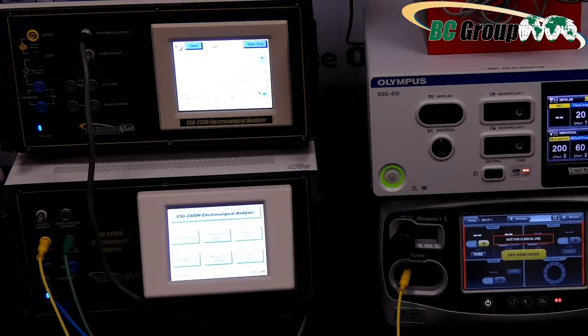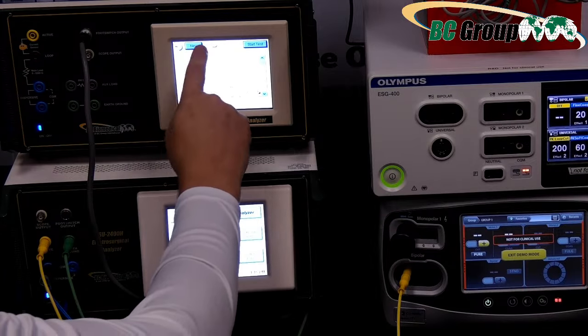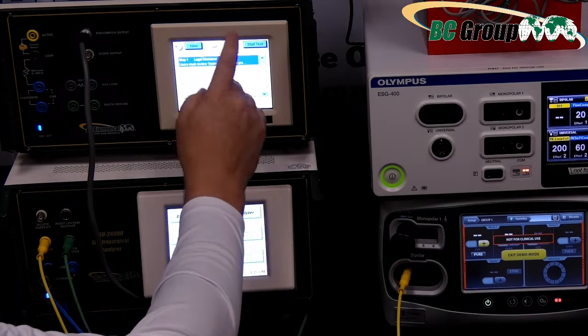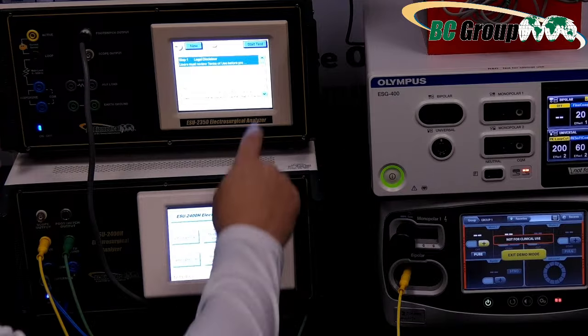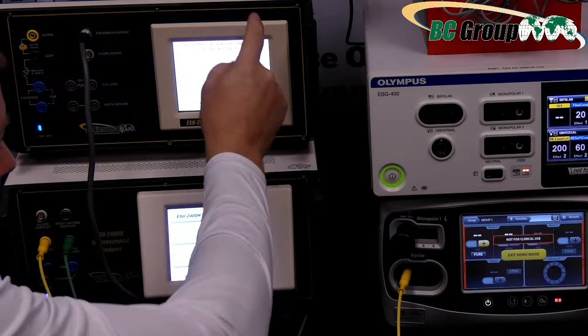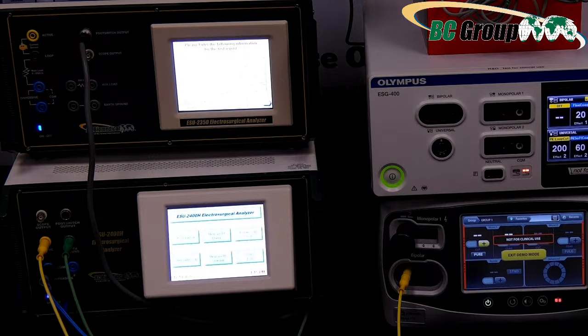It's kind of cool. I wish we would have had that 20 years ago when I was struggling as an entry-level biomed. And then you can look at the different steps of the test. There's obviously a lot. We're not going to go through them, folks, we would be here for the next hour and a half. And then you click Start Test. And unfortunately, I've got to dim it down a little bit more. This is a bright screen.